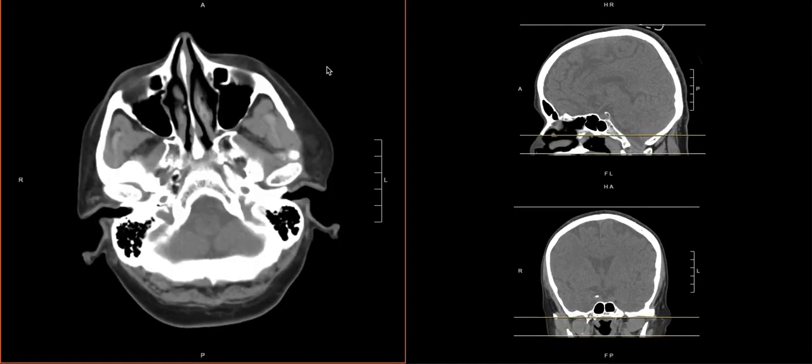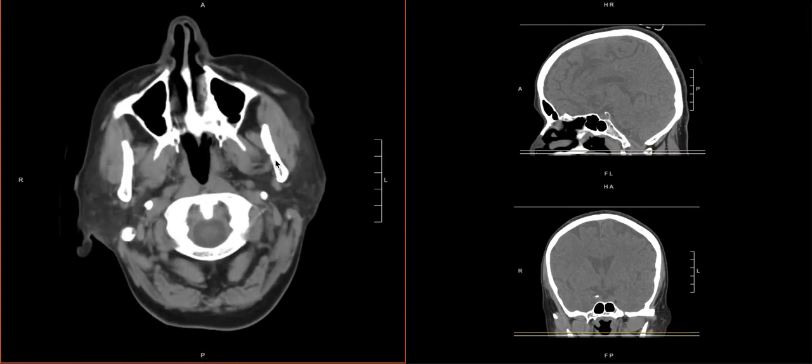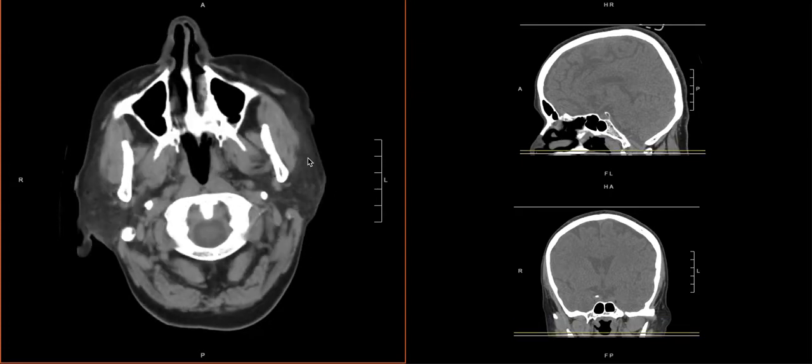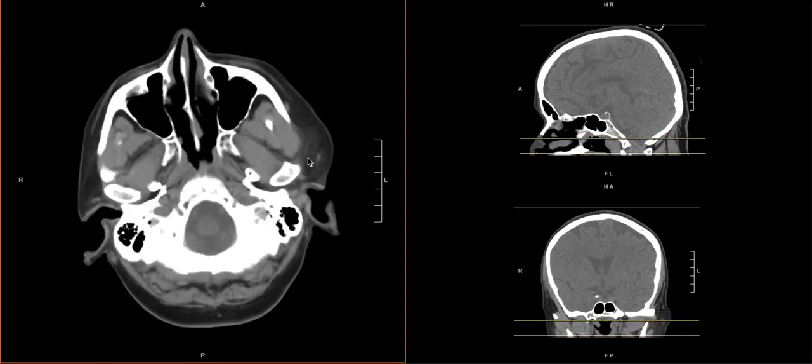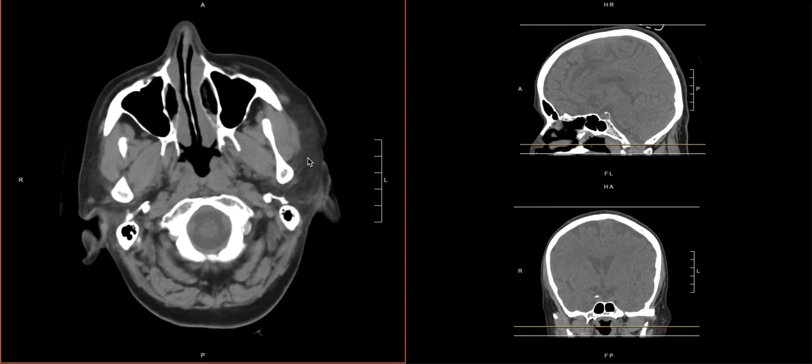As you scan down too, it's important, you can put this at any part of your search pattern, but I just do it with the anterior part. You take a look at the pharynx here as well, and you can look at the tonsils. Just make sure there's no tonsillar abscess or pharyngeal abscess, retropharyngeal abscess, or other masses.